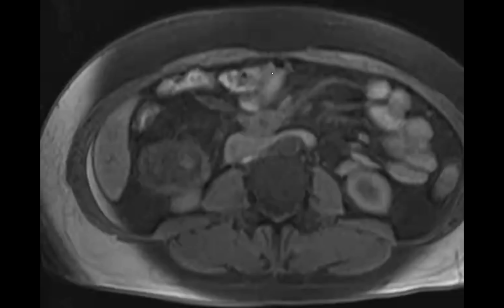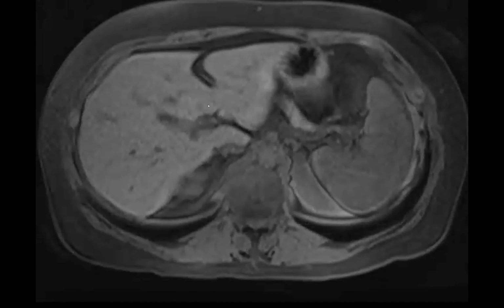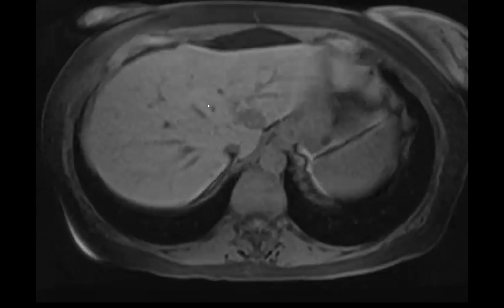We see these cases where people call hemangiomas, and I have like a collection at this point, and there's something not right about it, right? Like you can sort of see why they were going into hemangioma realm, but there's something not perfect about it. And I think that, if it's not perfect, at least say, like get a follow-up, or there's something about it that's not classic.